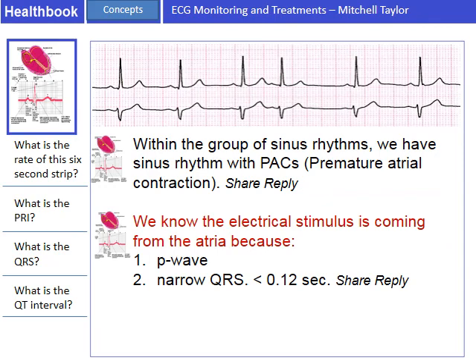Okay, and then a couple of other rhythms I just want you to be aware of. It may play into the role of tachycardia, but you might see it in bradycardia, you might see it in any rhythm. Two groups we would see: when we're measuring, is this rhythm regular? So we take R to R, and whoops, there's a beat that came early. So we call that a premature beat. Now, is it a premature atrial contraction or a premature ventricular contraction?